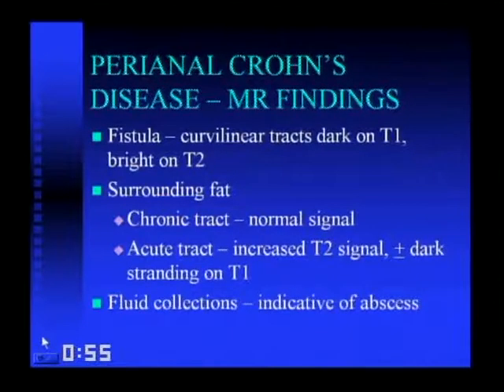The skin, the muscles, they go up, they go down, they go all over the place. Typically, they'll go to the cutaneous surfaces of the buttocks or the perineum. They will be dark on T1 scans, they will be bright on T2 scans.